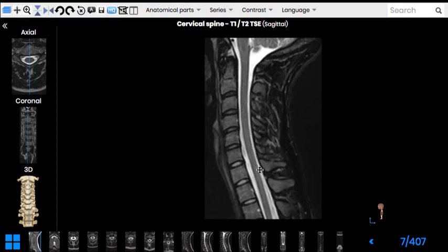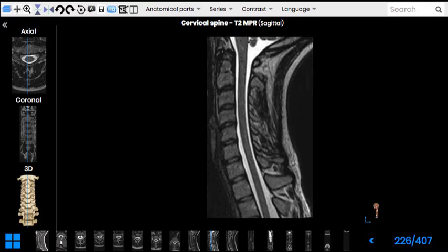And have a look at the fluids, the liquids, the edema, the traumas, the bleeds: they appear bright on T2 weighted images, while the fat and other soft tissues are not so bright. And it allows the traumatologist to find the pathology, the edema, the bleed very quickly on the T2 weighted images, while anatomy mostly uses T1 images to evaluate the relations between the organs, the shapes of the organs and structures. So for anatomy, T1 is more useful, but for pathology, T2 is considered to be useful.